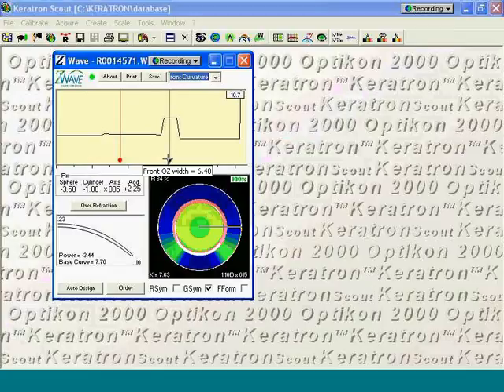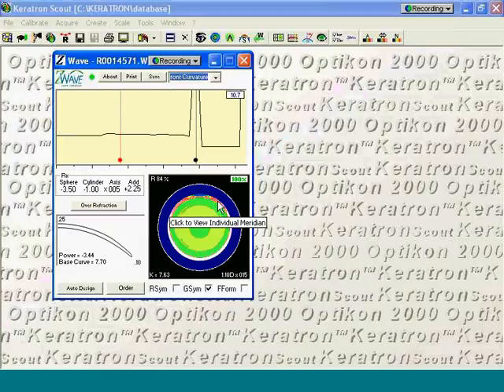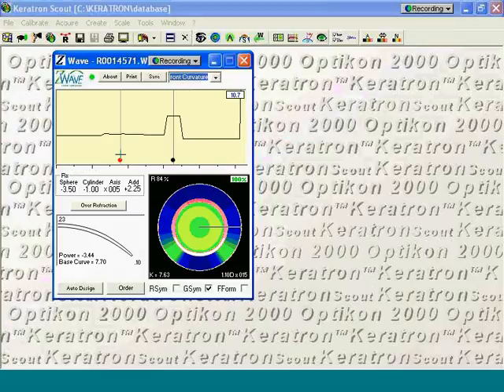This next control point is the anterior optic zone. As you can see, we can make it larger if we want to, and we'll get a junction on the front surface of the lens. If we keep it to a smaller size, it will prevent us from getting too close to the pupil because we need a certain area to create our add with. If I push this too far to the left, it will prevent it from going any further.